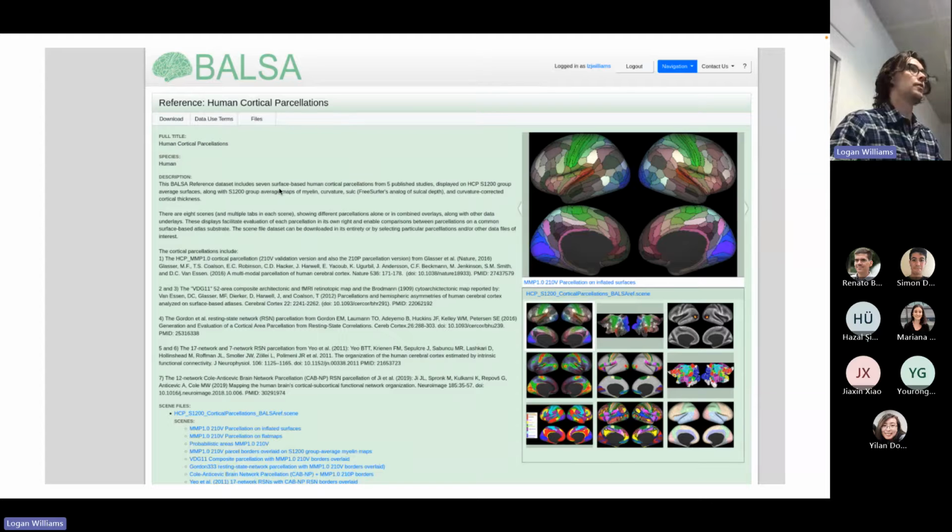It is also a really nice way to make figures, although it takes a little getting used to, but it saves you from making figures over and over again. And these things called scene files can be downloaded by anybody and viewed in exactly the same way that you've represented it as a figure in a paper, which I think is really cool.